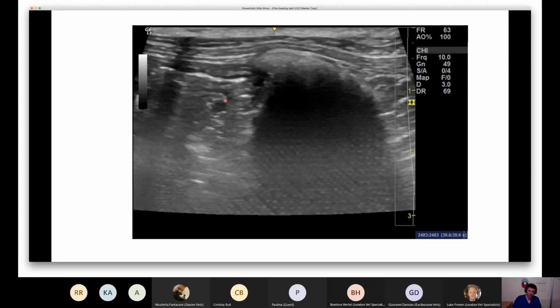So this isn't something that has been eaten and is just in the lumen of the descending colon. Now on the radiographs, it very much looked like it was adjacent to the colon rather than within it, but I just wanted a little bit of reassurance as to exactly where this structure is likely to be.